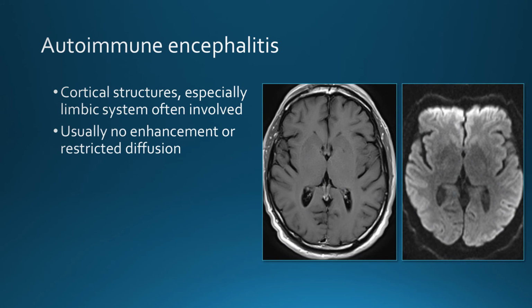So most of the time there's no enhancement and no restricted diffusion. Sometimes there can be restricted diffusion, but it's usually not prominent. Usually doesn't have significant amount of enhancement in these patients.